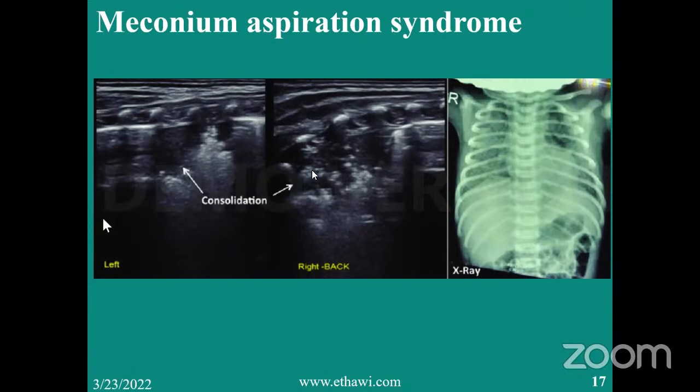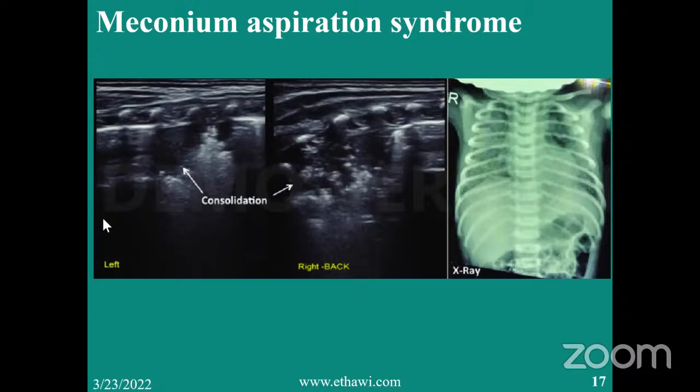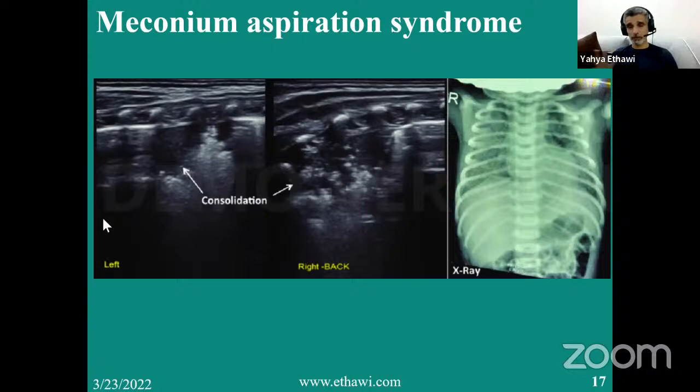No question? So the only way, Doctor, to differentiate is the history, because without history I will only describe this lesion. So when you do meconium aspiration, first it is a diffuse pattern. It affects all the body. It does not affect a local area like pneumonia. Second, pneumonia can be lobar or translobar, so everything is involved or a location only. You will never see normal, abnormal, normal, abnormal, because meconium is a disease of change and it includes all the lung. That's how you differentiate.